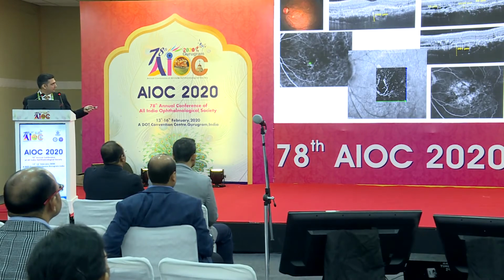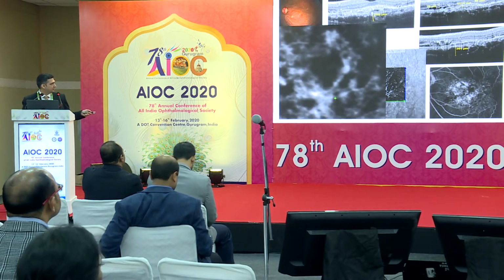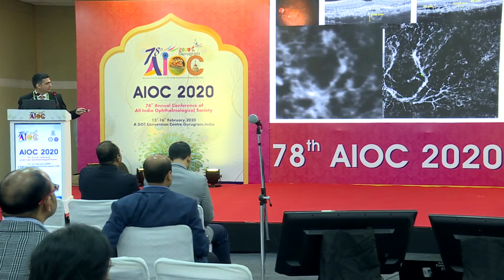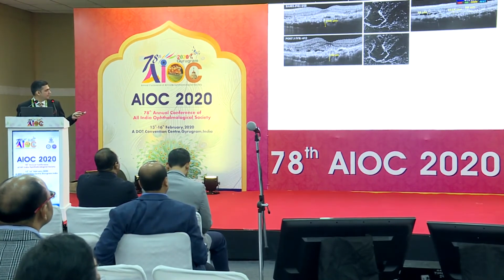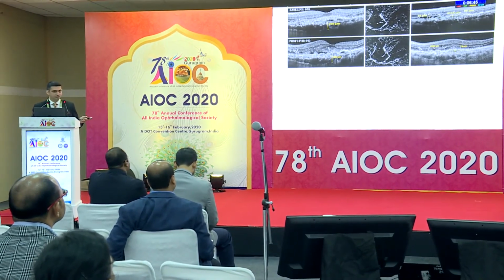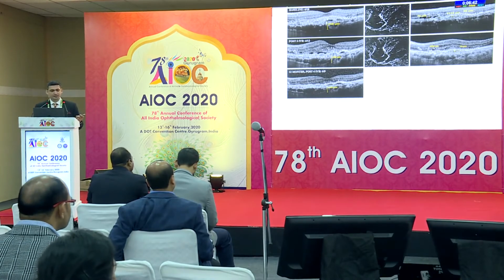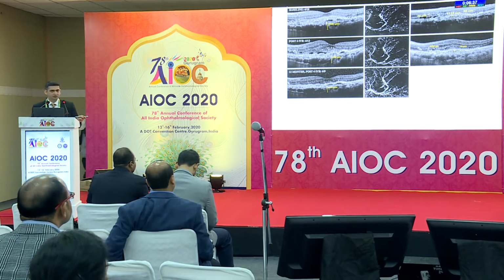On ICG, it showed a very early network, but the OCTA was very conclusive. This is the zoomed-in image of the ICG showing the network of vessels, and correspondingly the network could also be seen on OCT angiography. For this patient we started intravitreal ranibizumab treatment. After 3 doses, there was improvement in the subretinal hyperreflectivity, visual acuity started improving, and there was reduction in the length of the DLS. Twelve months later, after 6 injections, the visual acuity improved to 6/9. There was improvement in the network also.